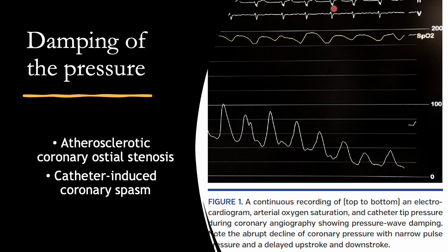To understand it better, imagine the catheter is a drinking straw full of water. If you press the tip of the straw against the wall of the cup, the water inside gets trapped and cannot wiggle back and forth. As the fluid is physically stuck, the system becomes sluggish. It goes deaf to the high speed detailed vibrations of the heartbeat. As it cannot feel the fine details anymore, the waveform on the monitor loses its sharp points; it becomes flattened, delayed, and unnaturally smooth, which we call damping.